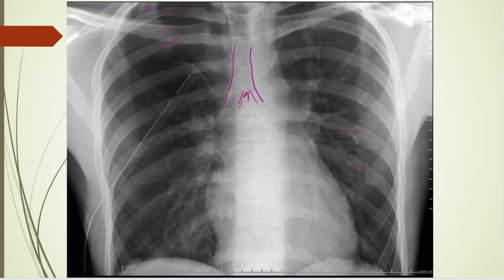But you do see a couple funny things. We'll pick that up here in a second. C for cardiac silhouette right here. D for diaphragms. What diaphragms you do see. All right, E for everything else. So let's do patient's left side first because we know something's going on with the right side. And I see good lung markings all the way out. So left lung looks fine.